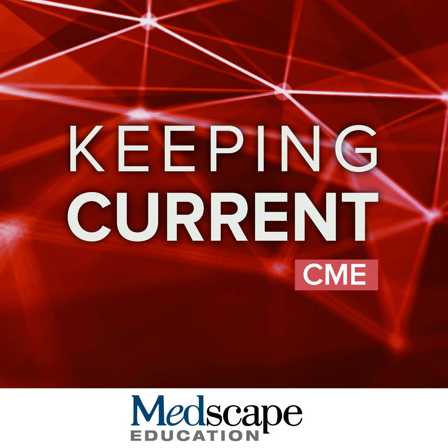That's the broad distinction between these two entities. So this is a pretty standard myocardial infarction. You see a very dilated left ventricle with an akinetic and thinned anterior wall and transmural enhancement of this area of abnormality. This is a transmural enhanced myocardial infarction.